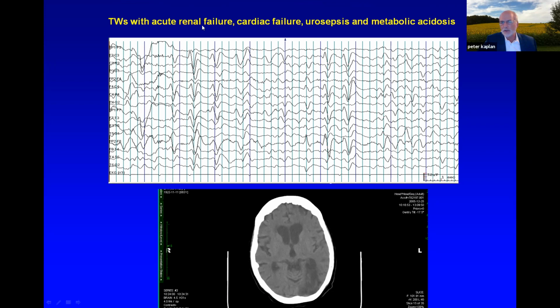Here you see up here these interesting waves that have an antero-posterior lag. It occurs earlier here in this 1 second piece, and then it goes posteriorly. And this waveform is maximal in the frontocentral region, not in the frontopolar, which is more anterior.